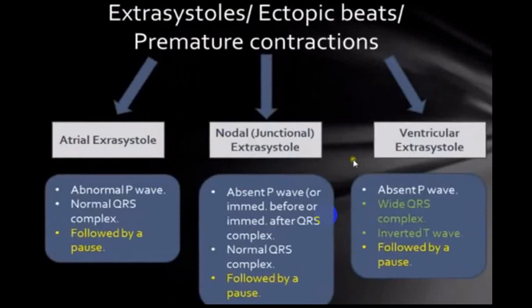Hence, the ventricle does not fill up as well as in an atrial extrasystole. But the ventricle has got a little amount of blood, and this QRS complex has got a normal transmission from the AV node to the bundle of His and then to the ventricle. So it produces a ventricular systole. So you get an apex, but the pulse may be of very low volume, and this QRS complex is followed by a pause again, which is non-compensatory. It is not a complete compensatory pause.